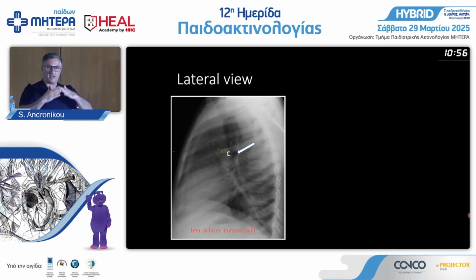So that is the carina where the trachea splits, okay, where the C is, where that little circle is, which means the airway below that is bronchus intermedius. Most of it is bronchus intermedius. There should be nothing behind the bronchus intermedius. There should be nothing underneath the carina, except for vessels separating, okay?